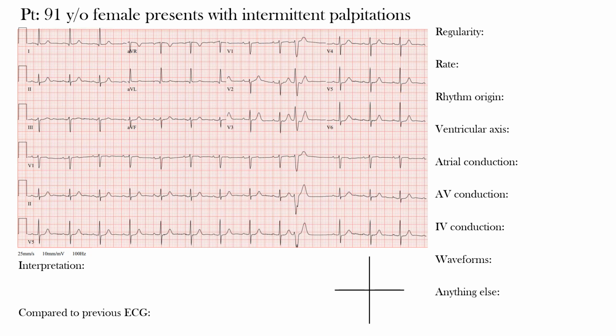So this week's case is a 91-year-old female that presents with intermittent palpitations. Her presenting EKG is shown here.